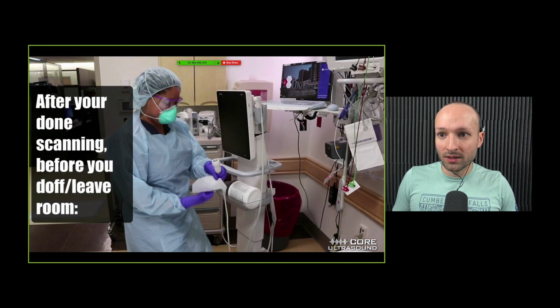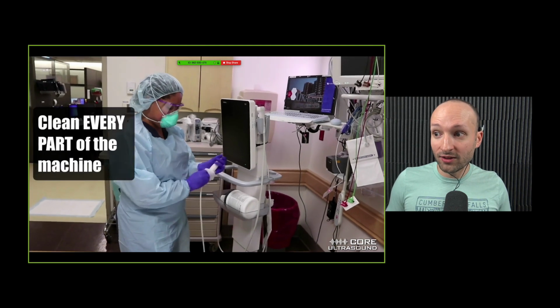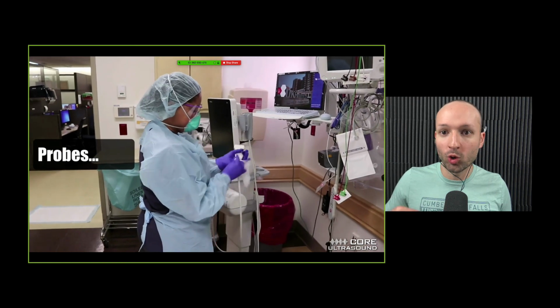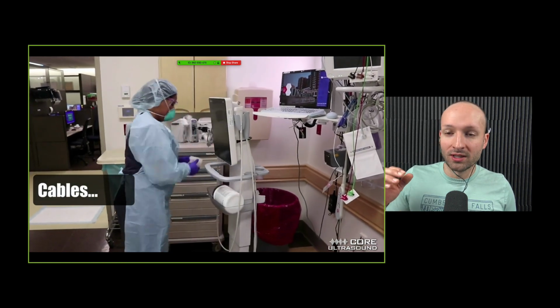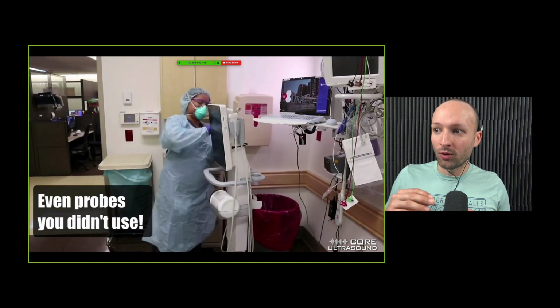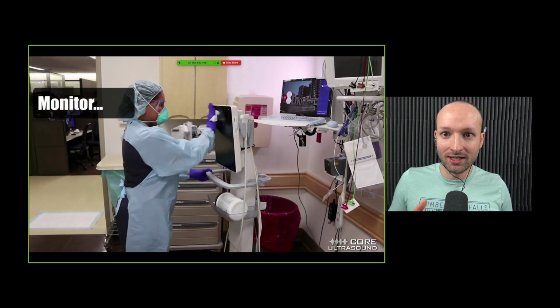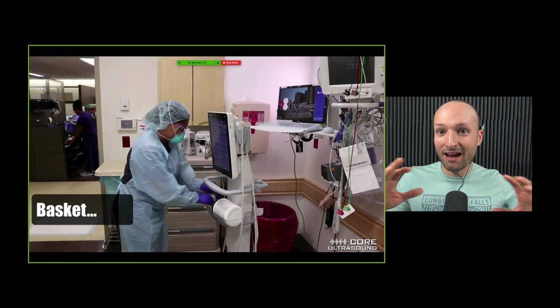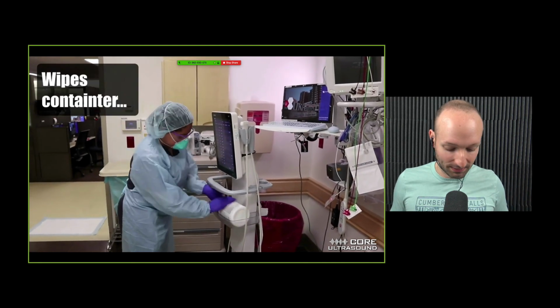Then when you're done, before you doff in the room, clean every part of the machine. So you want to clean the probes, the other probes, the handle, the whole machine, the basket, the base, everything. You even have to clean the back part of the machine. Basically, everything of this machine needs to be cleaned to keep it safe.